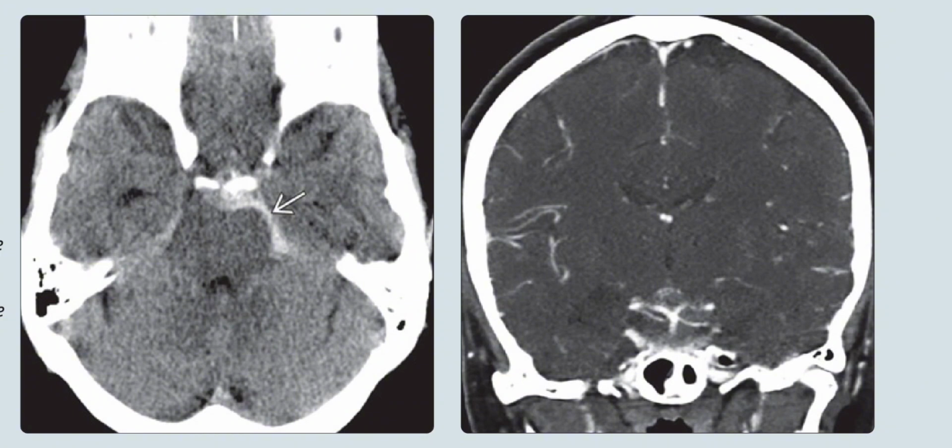The high density in the vessels is easily discernible even with the presence of significant subarachnoid hemorrhage. DSA not shown here confirmed the absence of aneurysm, and this case illustrates the classic findings in perimesencephalic subarachnoid hemorrhage.